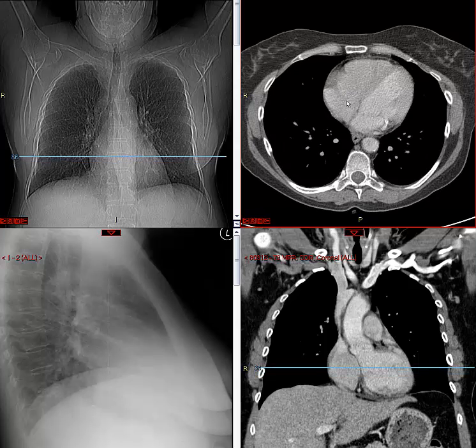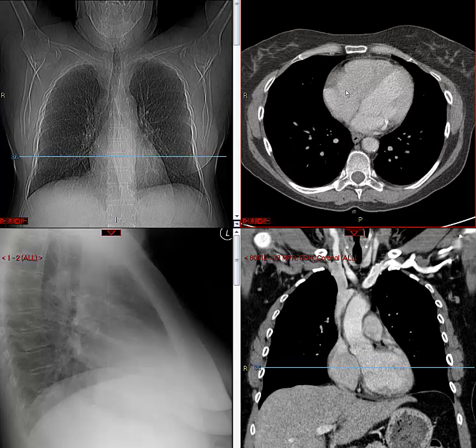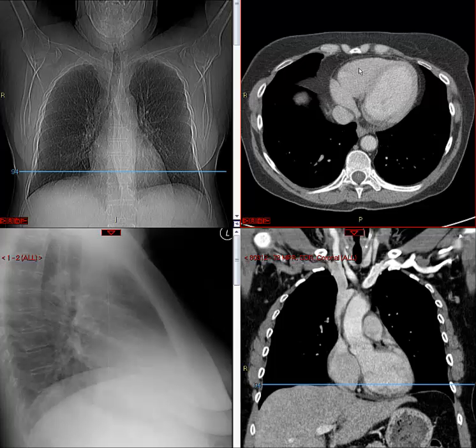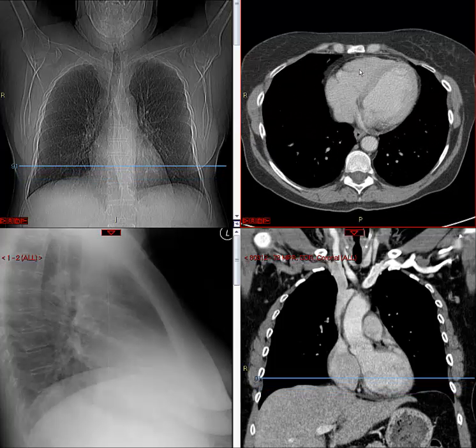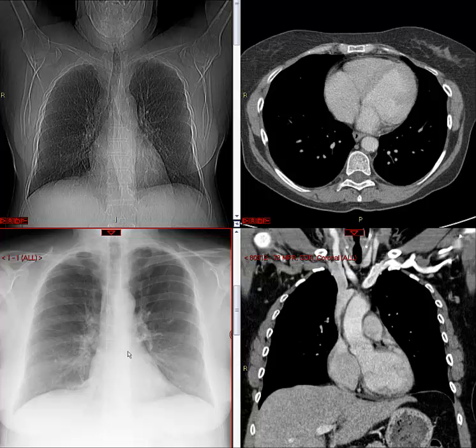Okay, so once the blood leaves the right atrium, it's going to cross the valve, which is right in this area, and go into right ventricle. And notice that the right ventricle is a very anterior structure. Because it's very anterior, you're not going to see it much on the right or on the left. It's more in the midline, so you won't see it directly on the frontal view.